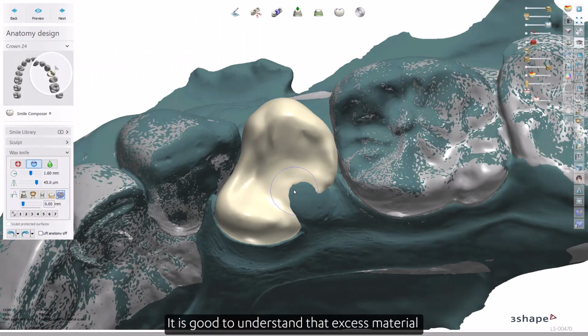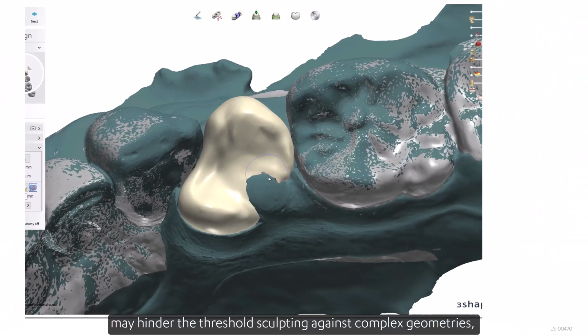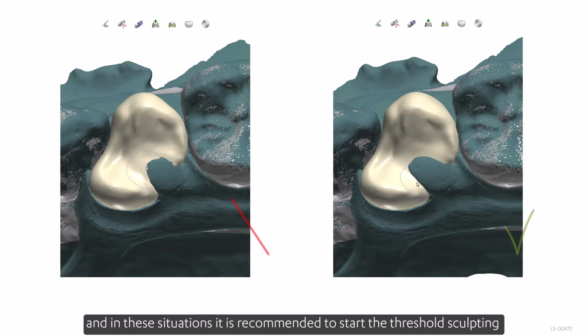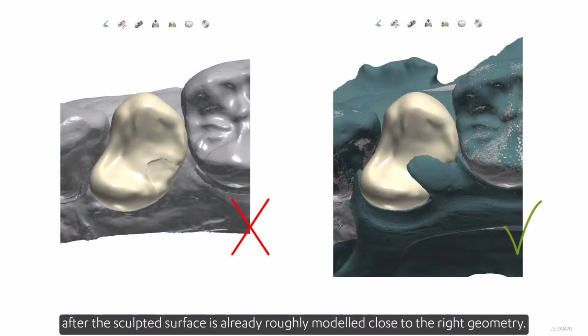It is good to understand that excess material may hinder the threshold sculpting against complex geometries, and in these situations, it is recommended to start the threshold sculpting after the sculpted surface is already roughly modeled close to the right geometry.